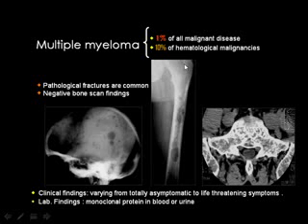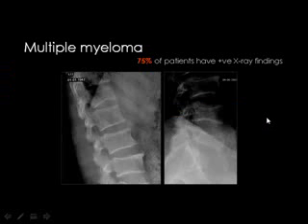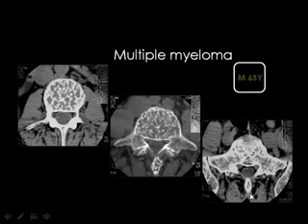The myeloma lesions are usually osteolytic. They give negative bone scan findings. They usually are of almost similar size to each other, and they are absolutely osteolytic. Then you can diagnose the lesions by the presence of characteristic proteins in urine, and you can see these lesions by CT or by MRI. In the plain X-ray, you can see osteopenia of the vertebral bodies and partial collapse, like this one, you see a partial collapse of L5 and this D12 or L1 vertebral body as well.